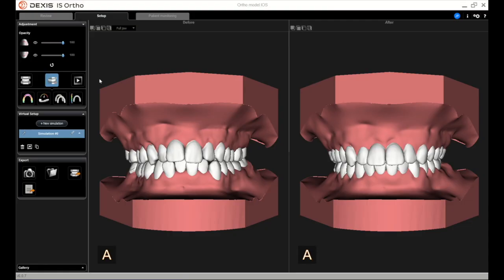I want to show you one more, or maybe two more things. So first of all, we have the option to take a screenshot of each layout that we have, and later on we can open the folder with the gallery here, and this is located on our computer.